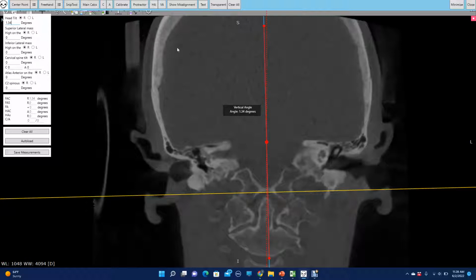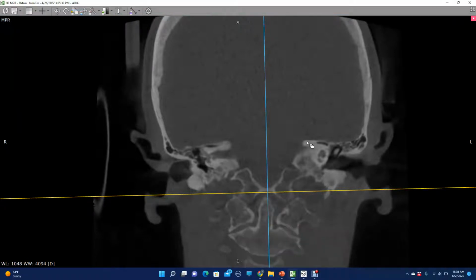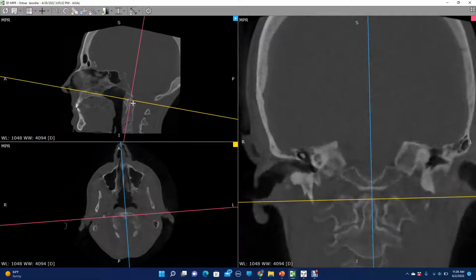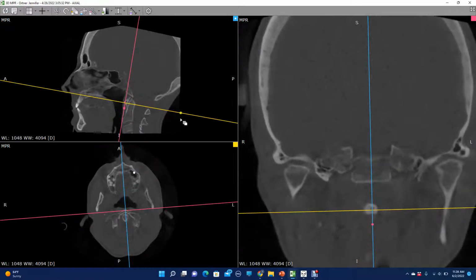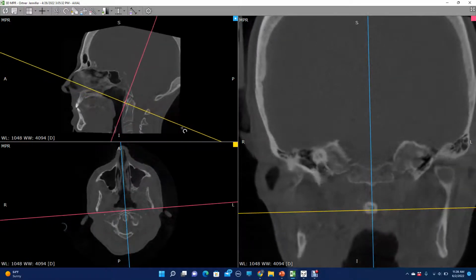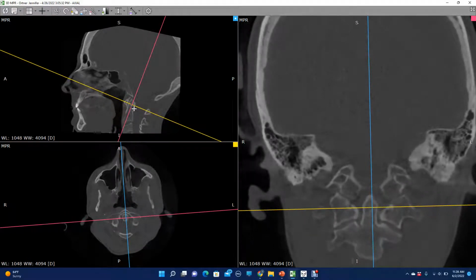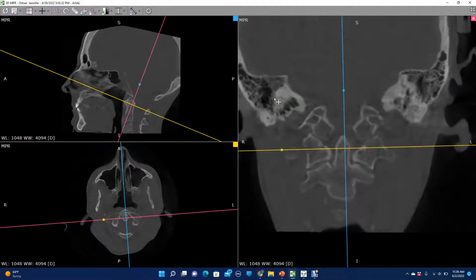So, after this, what I like to do is come back to my cone beam and prepare my atlas shots. And typically in traditional work, we would look at the atlas along the atlas sagittal plane line. So by orienting to my atlas sagittal plane, I can see everything I'm going to need. And the way I've been saying it is that we're taking the x-ray by positioning these and then we measure. And so here's my atlas.